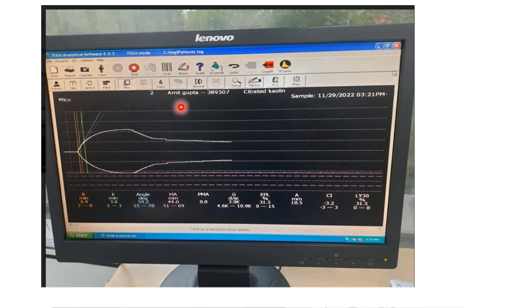So this was another patient's TEG graph. Here you can see the R time is 6.4, which is normal. The K time is 3, which is also normal; it's on the higher normal side, but it is normal. And the alpha angle is 59, which is also normal.